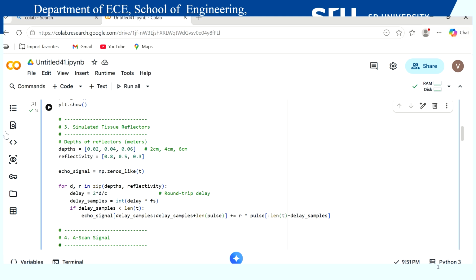So echo_signal[delay_samples : delay_samples + len(pulse)] += r * pulse.